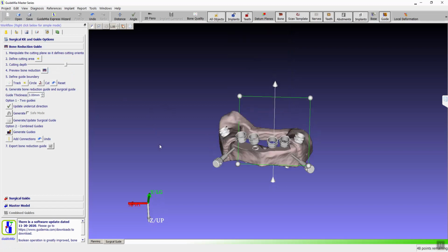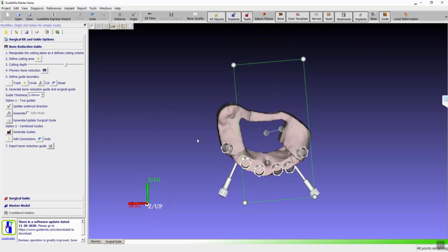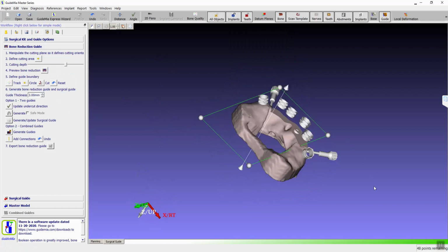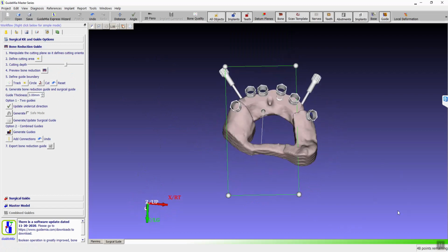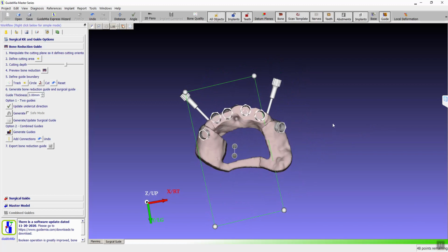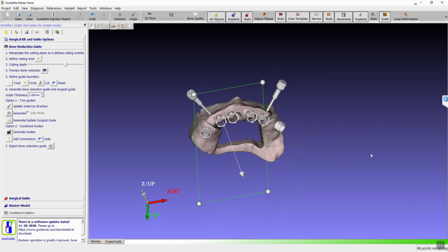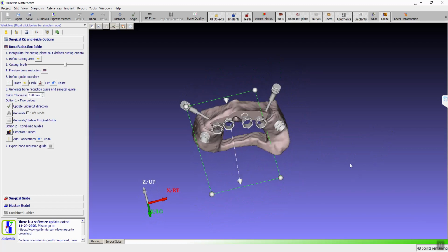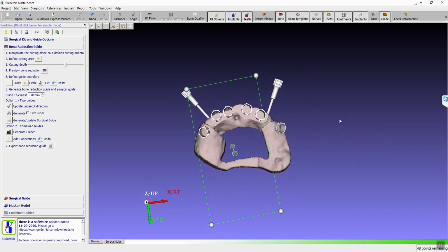By the way, Brian, this step, the bone model, is quite improved. You see, I click this, it gives you the results right away. Yeah, that's nice. With the older version, it takes a long time in this step. Now we got it quite right away. And by the older version, you mean Wednesday of last week? Yeah, it's been like that, slow.